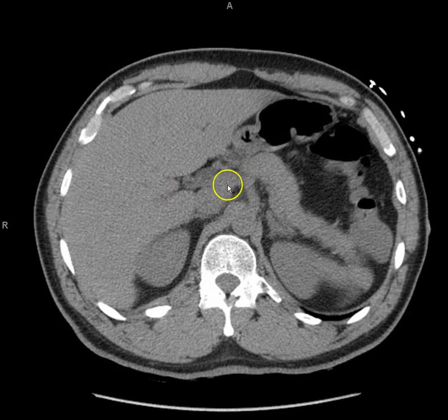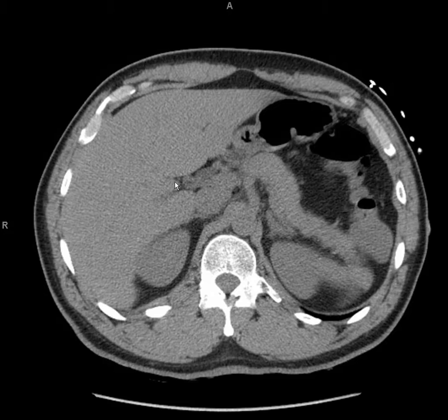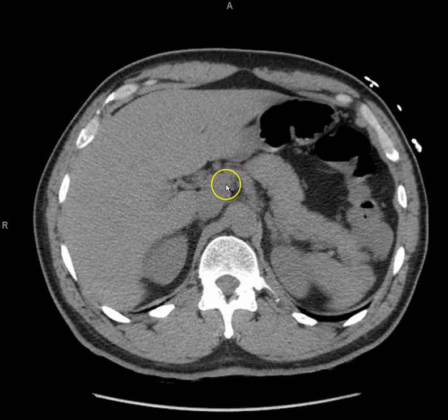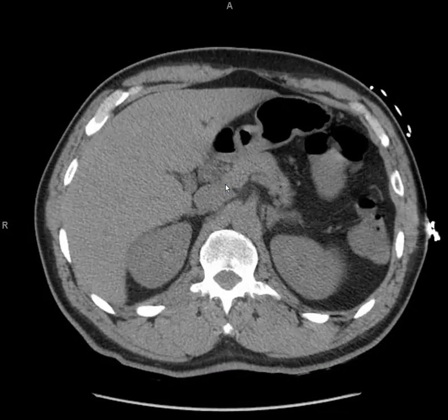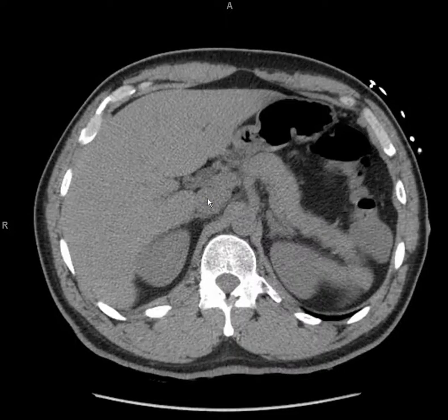It's hard to see, but it's a vessel going here. It is a vein. Which vein? Not duct, I said it's a vein. It's the portal. And see, this is the portal. And the IVC is here.